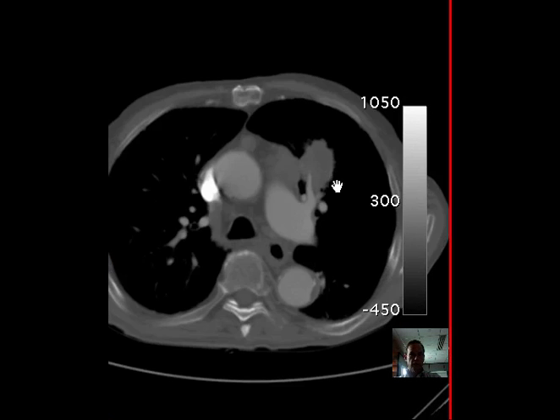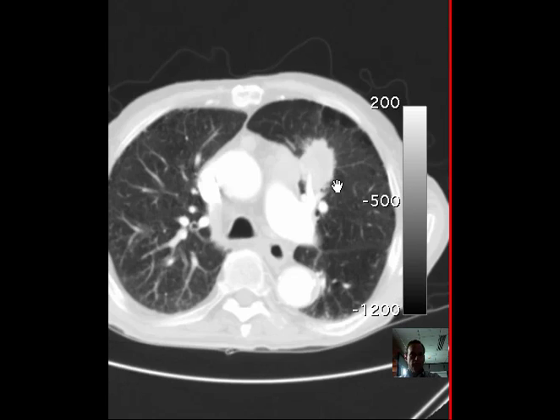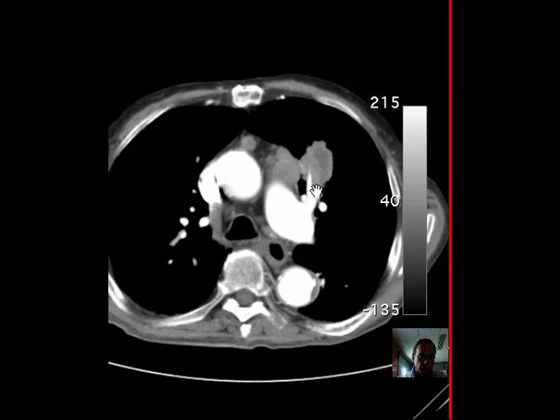And if you look at it on a lung window, it kind of looks a little bit more like what you might expect based on the chest radiograph. Anyway, you can really see that mass more clearly. You see the whole perimeter of it all the way around. You see its relation also to some of the pulmonary vascular structures in the hilum.